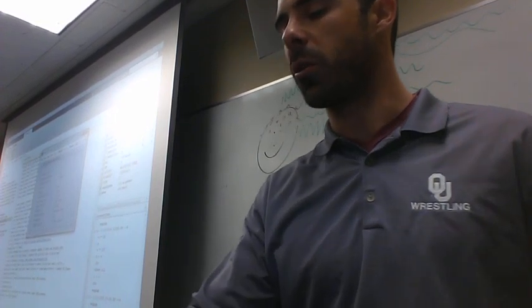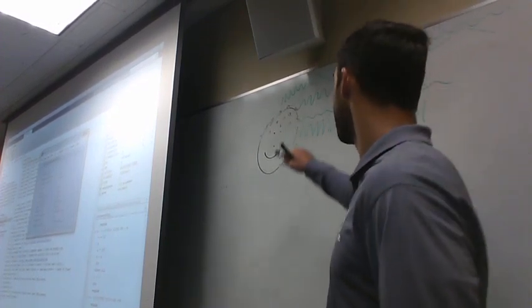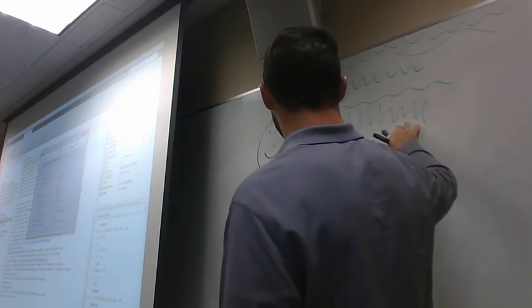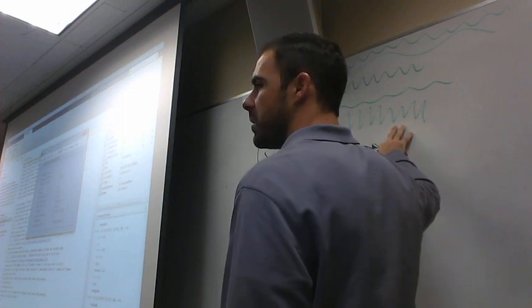So let's talk a little bit more about this data that we're getting. Okay, we have all this data coming in. Now we have this loaded into our MATLAB workspace, and it's representing this activity that's been referenced.